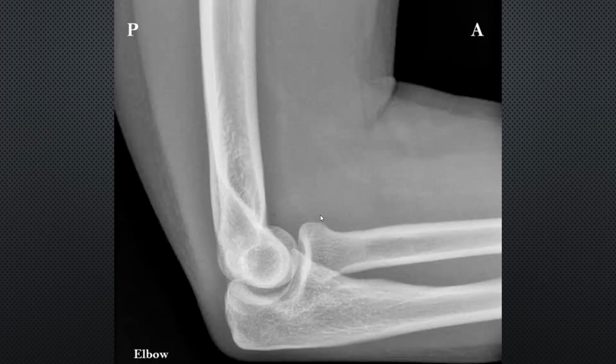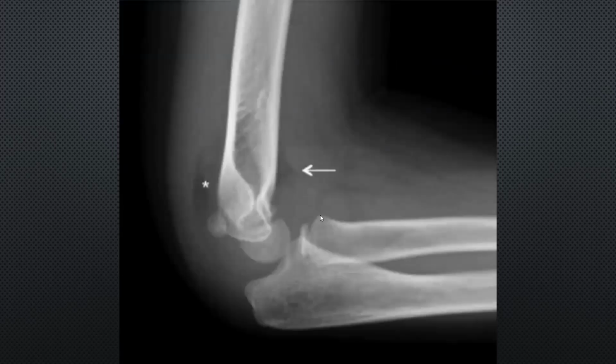Here, anterior and posterior fat pad sign is there. Anterior obvious, posterior obvious, right? Yes, sir. Type 1. And regarding the anterior humeral line transecting? Yes. And the radiocapitellar line transecting? Yes. And what else?